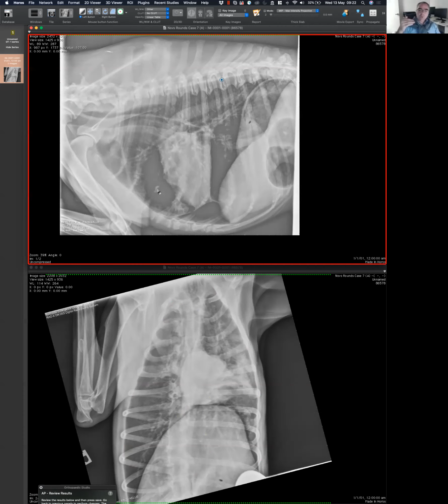So what are the options to not having that being overexposed? I think one option that we should be considering, probably we can consider two options. One option is that there is no lung there. Makes sense? Is it that now there is pneumothorax, and now the lung is separated from the wall? That is one option. And the other option is, is it that the lung has now more gas? Is the lung being hyperinflated? Like a bronchial disease, maybe with asthma.